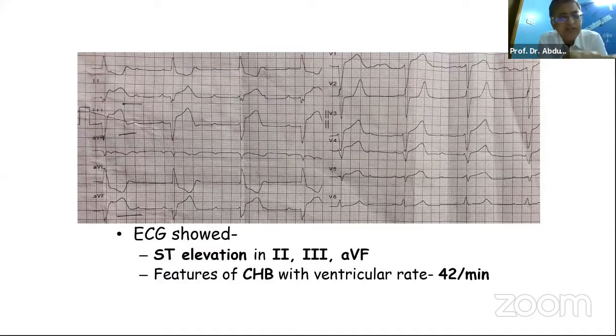Can I add something? This patient has LBBB morphology, but the T wave is upright in laterals, in 1, in aVL, and also V5-V6. That suggests there is an ischemic origin, and that's also helpful regarding that this could be an MI, though we could not be sure which arterial territory is involved. This has been told before. And then this is actually a complete heart block and escape rhythm, right?